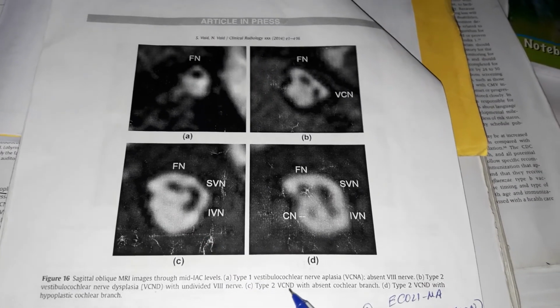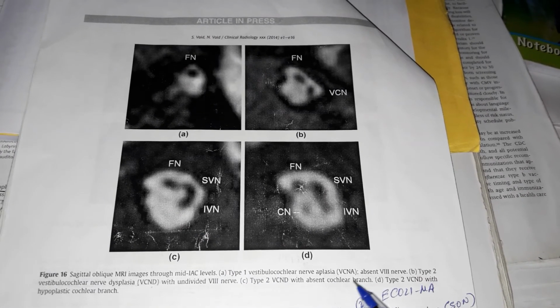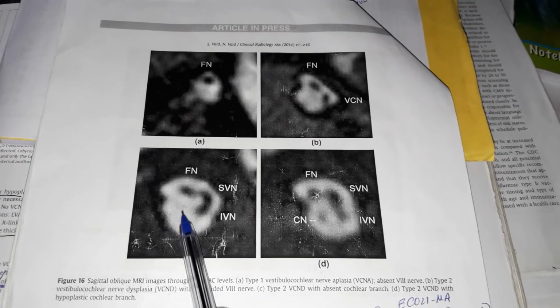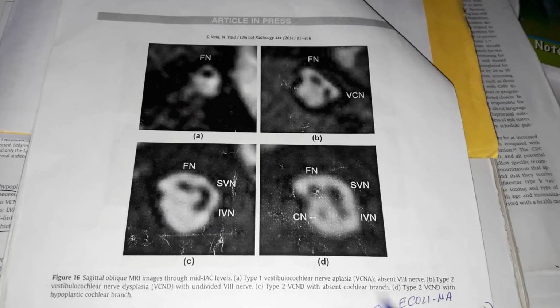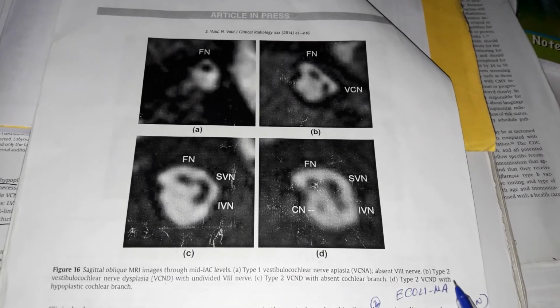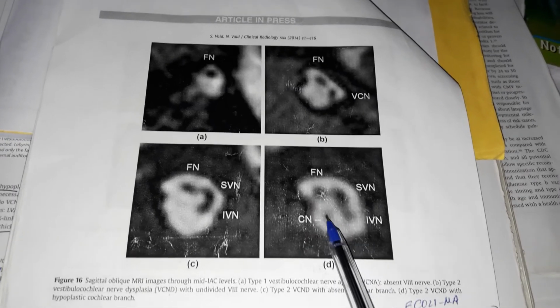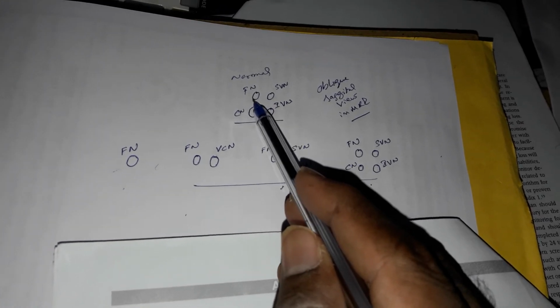This is type 2 vestibulocochlear dysplasia with absent cochlear branch. Here there is no cochlear branch, no cochlear nerve. Type 2 vestibulocochlear dysplasia with hypoplastic cochlear branch. Normal is like this: facial nerve, superior vestibular nerve, inferior vestibular nerve and a larger cochlear nerve, larger than all these three nerves, or you can say larger than the facial nerve.